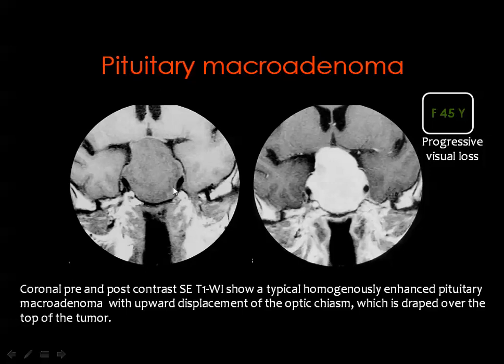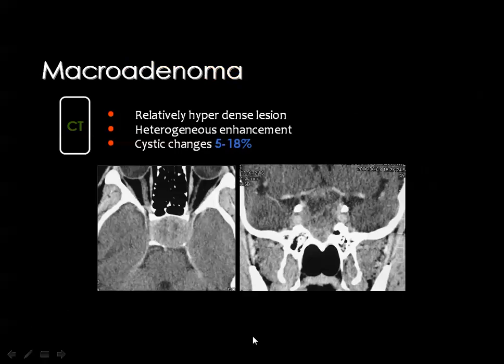The pre-contrast coronal T1 and the post-contrast coronal T1 weighted image show a big pituitary mass, and this mass is occupying and expanding the sella with extension into the suprasellar area that has compressed and flattened the optic chiasm, as well as indented the region of the hypothalamus. And here you can appreciate the internal carotid arteries within the cavernous sinus. The arteries are patent as judged by the signal void appearance.